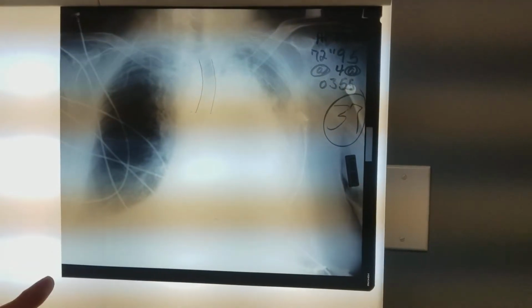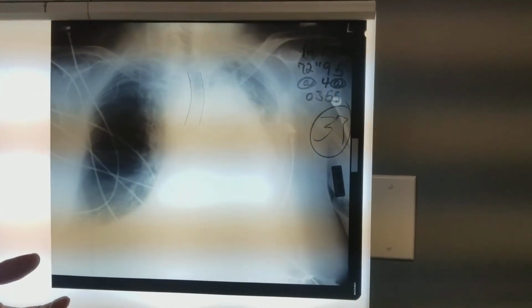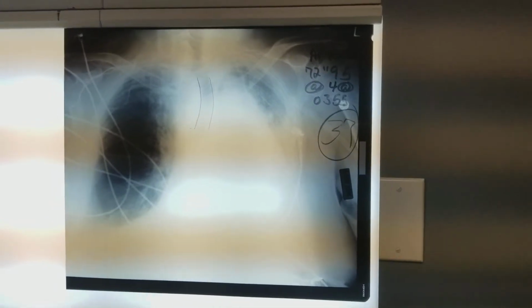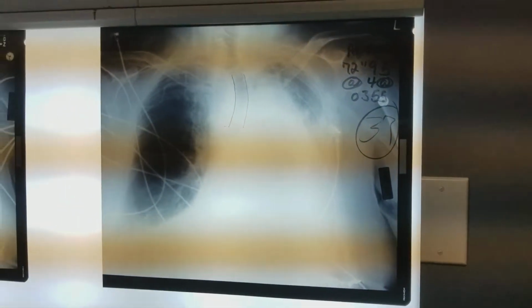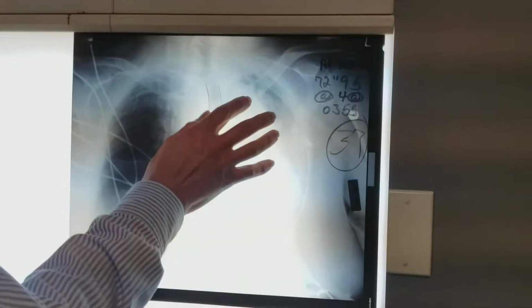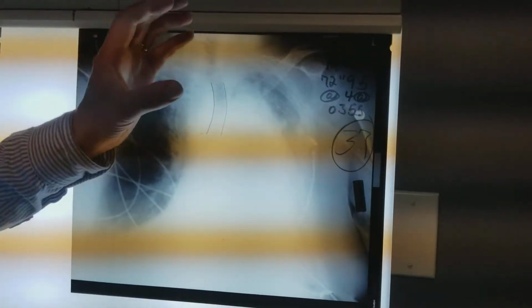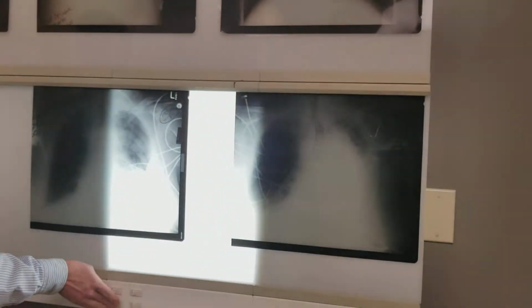Now, there's a few things that cause atelectasis. It could be hypoventilation. If that's the case, we need to add some positive expiratory pressure, possibly CPAP, something to hyperinflate the lung. But if it's airway secretions, they can cause atelectasis. Then that means we want to shake them up. So, if your mediastinum is going towards a process, that's atelectasis or alveolar collapse. Okay? Start here.